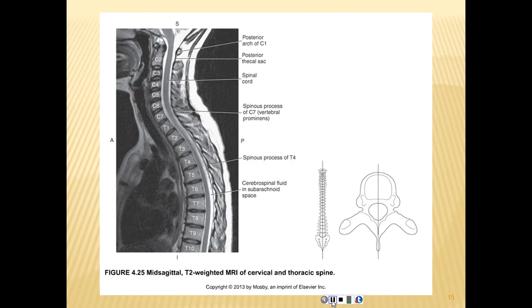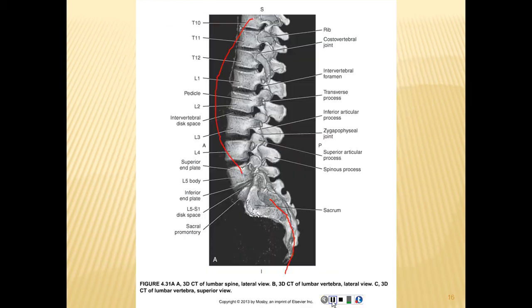Again, you have to be called to label the T-spine sometimes, or even the C-spine. So you have to be very comfortable with labeling the vertebra. The radiologist will have you do this so that they can interpret the images faster. So you have to be accurate.